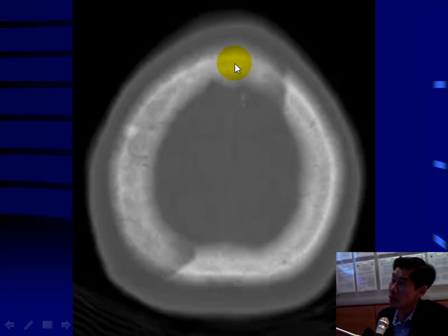So in the skull, this is an axial image through the head, bone window. You can see, very interestingly, a pretty normal left side. On the right, there is a diffuse lytic process, very extensive, involving the entire right side of the skull, and a very sharp line. Notice that sharp line between the abnormal bone and the normal bone. I mean, how many processes do you know of that will do that? Really nothing. This is Paget's disease. Notice it's just like a straight line.